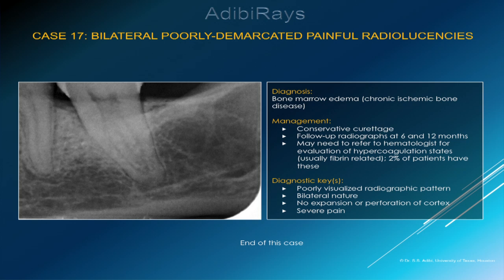Key diagnostic features are poorly visualized radiographic patterns that are bilateral in nature with no evidence of expansion or perforation of the cortex, along with severe pain.